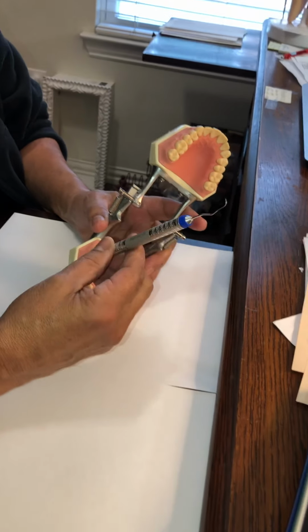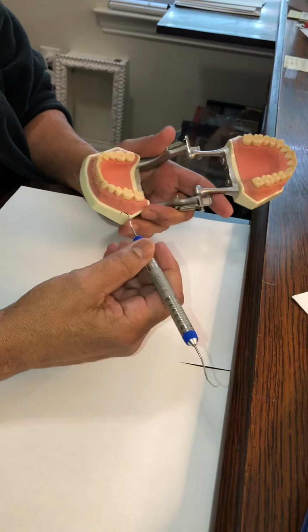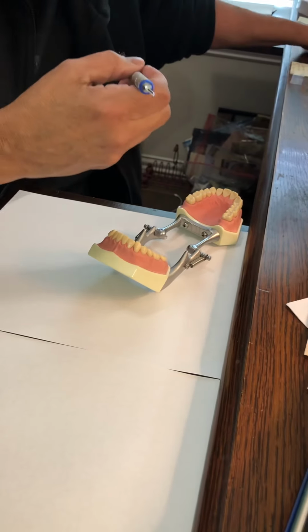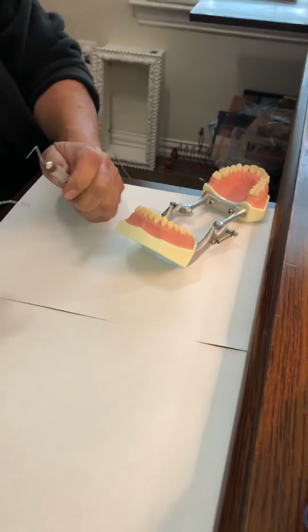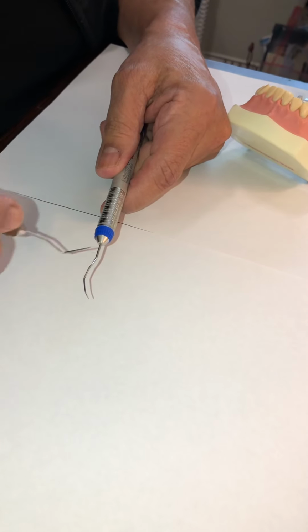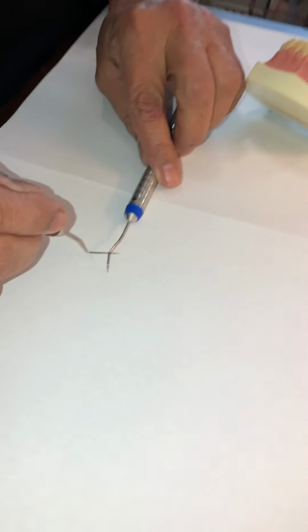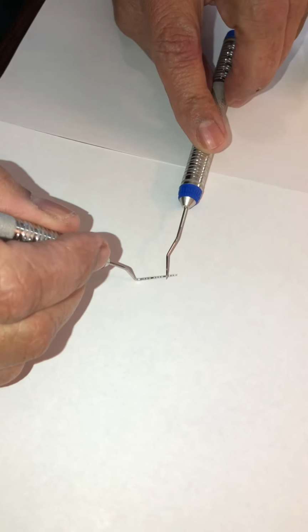Talk to you a little bit about the sequence for using the Explorer. And we talked about this already in our last discussion. We talked about the fact that this is the functional shank. This is the terminal shank, the shank that's closest to the working end. Here's the working end. This is the terminal shank.